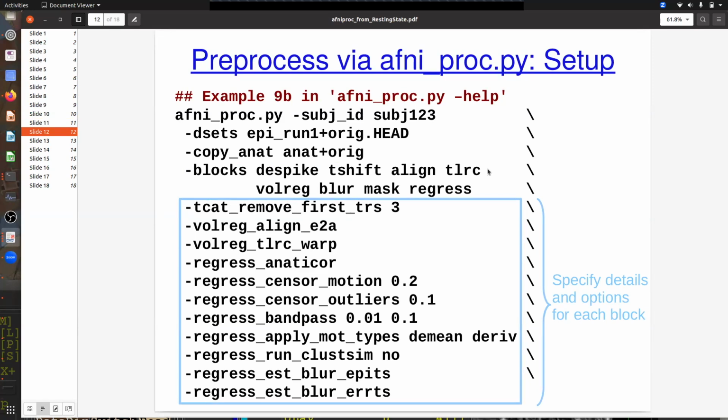Another thing that's a programmatic point here, these slashes that appear at the end here: when you run something either from a file or from a terminal, you basically take everything that's in one line as part of the command, and then you hit enter, and that's the end of it. If you want it to continue on to other lines so that it's a little more spaced out, rather than just wrapping around awkwardly in your document, you can put these line continuation characters. So this is just one giant command that we keep saying, keep reading to the next line, but visually it's not too bad because they're all lined up vertically.